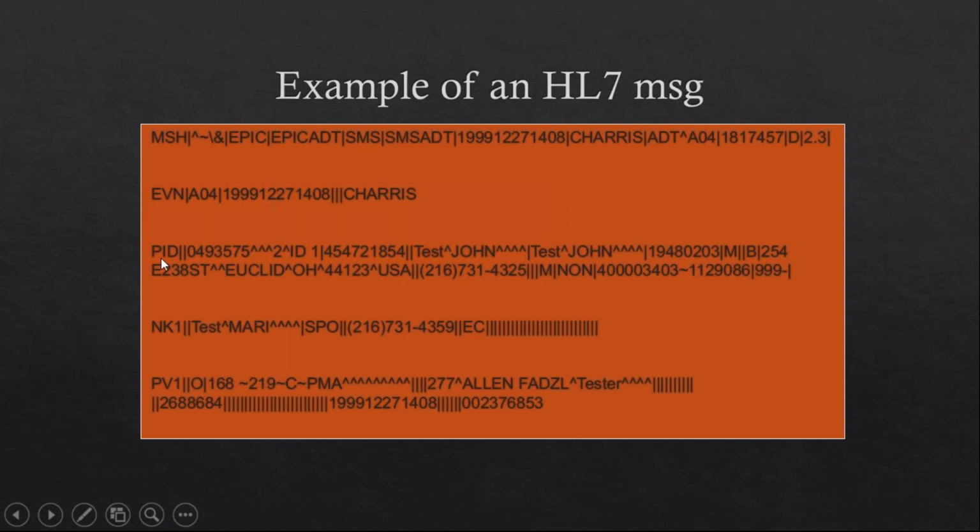We will look at a tool in further sessions which will interpret these fields for us in a numbering system, so that you can better understand how to read an HL7 message. But for now, PID5 is always represented by the name.